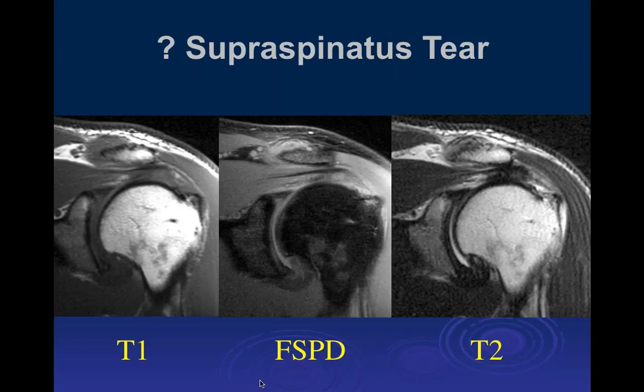But I really do believe that there can be situations like this where either it's scar in situ or the synovial covering there can still be intact, making it not possible to see the defect in the tendon arthroscopically. Obviously, if it's torn much farther back, you can't keep the synovial intact. But it is a phenomenon that does occur, and I've seen enough examples where I believe that it can be, and therefore looking at the integrity of that inferior surface, which is better seen on an arthrogram, is something that's important to look at for the radiologist.